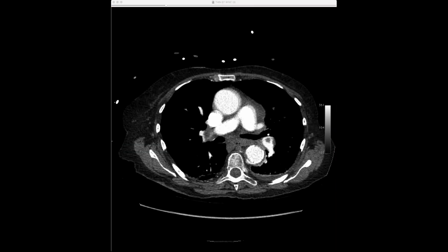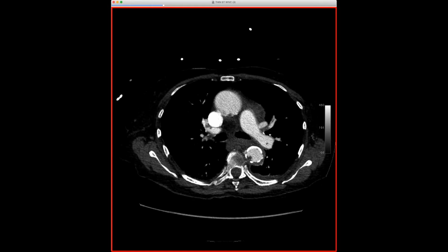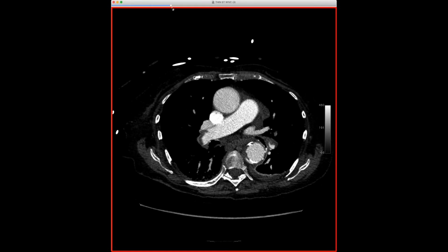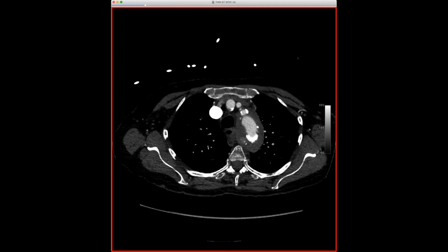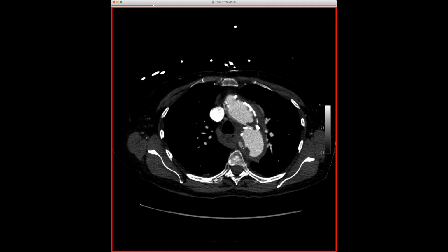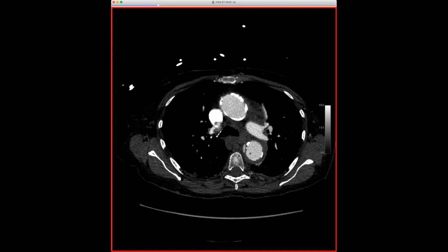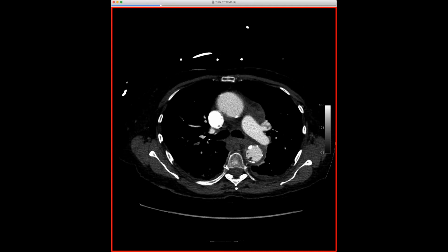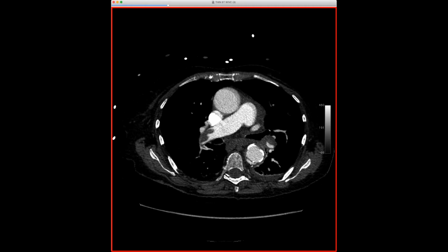So I can switch it over. Now you should see the contrasted studies. You can see she happened to have pulmonary emboli just for fun. But what I liked about this case, and we can get into a discussion about it, is we sometimes see slow flow in these channels, but in this particular case, we have much denser contrast, and you can see it running deep to the plaque. So it's clearly in the wall of the aorta, and so it has different little pockets here.